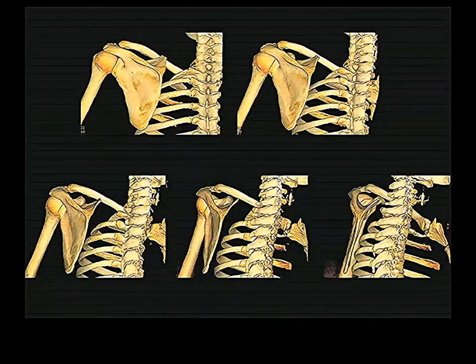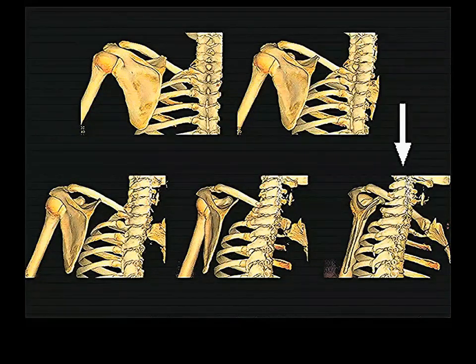All right. We're going to be looking now at MRs. And there's one thing I want to say about MRs of the shoulder. Now, this is just volume rendering from a CT, not from an MR. Looking at a person straight at their back, a posterior view, showing the scapula and the humerus, clavicle, blah, blah, blah. I have rotated it, or actually the computer has, so I'm staying here and you're looking at the back of my left shoulder. And now you're looking at the back of my left shoulder slightly obliquely. Even more obliquely, even more. When I rotate 45 degrees, that's what it'll be like.